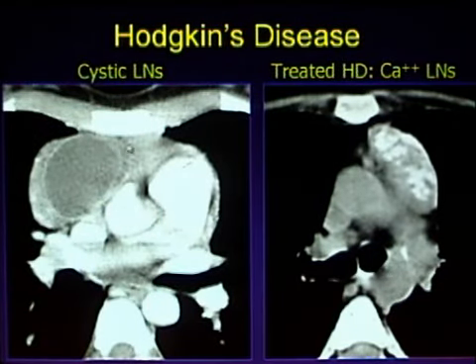These can occasionally have cystic lymph nodes, as I said, and as a reminder, bulky nodes remaining post-treatment, even after being treated, will oftentimes develop coarse, chunky dystrophic calcifications. So you'll end up with oftentimes visible on radiography, densely calcified anterior mediastinal nodes.